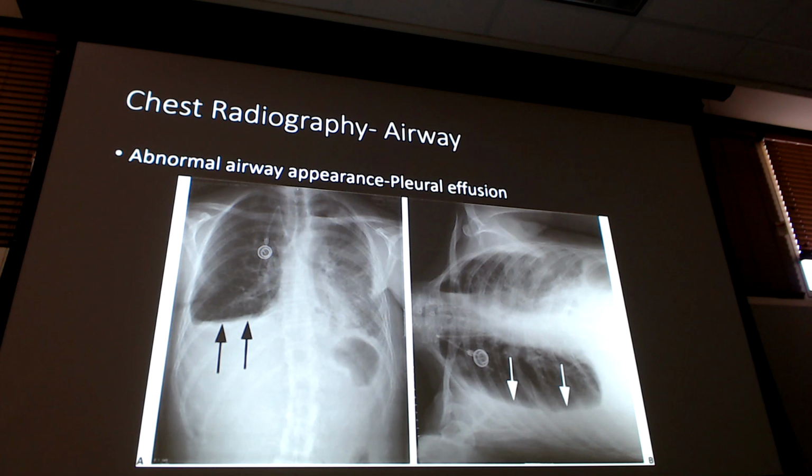This here is that decubitus one. They're lying them on their side so they can get an idea how much is actually there in that lung from the thorax and up, which gives them a better measuring tool. Because here's the thing with this one: I know you have a pleural effusion, but how much? I don't know where it started and where it went up to, so it can be difficult to evaluate how much is here.